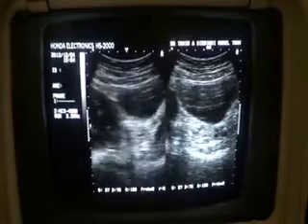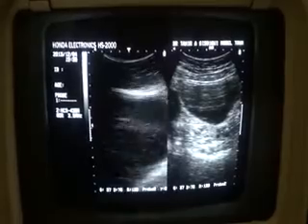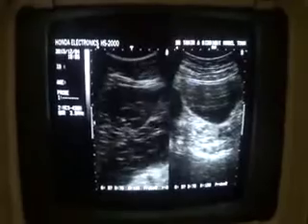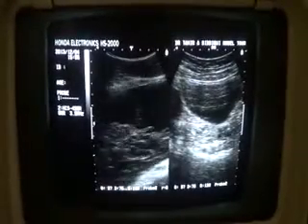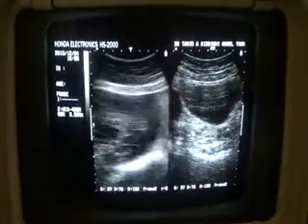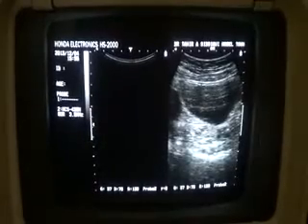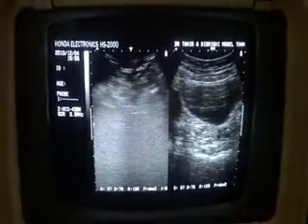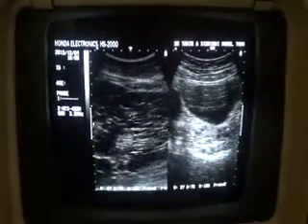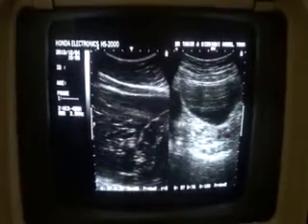and on the right side we see a large cystic mass with numerous internal convoluted septas, a thin-walled cyst that reaches almost the epigastric region, extending from the right hypochondrium.